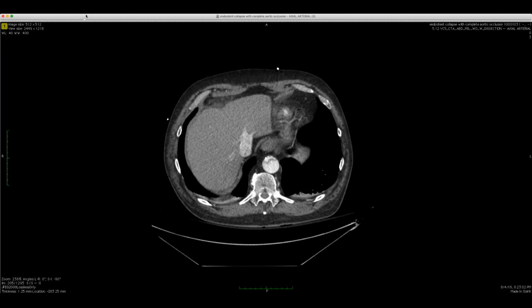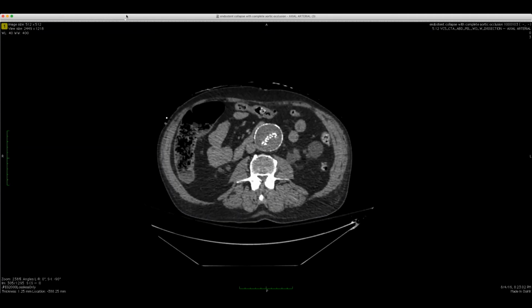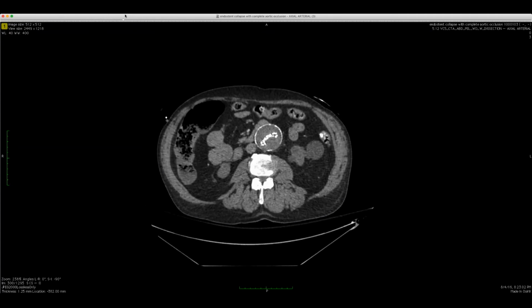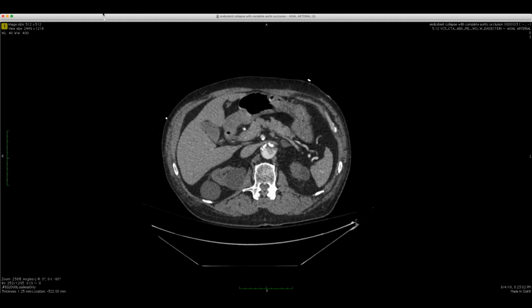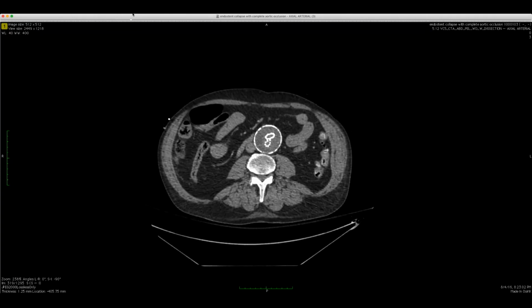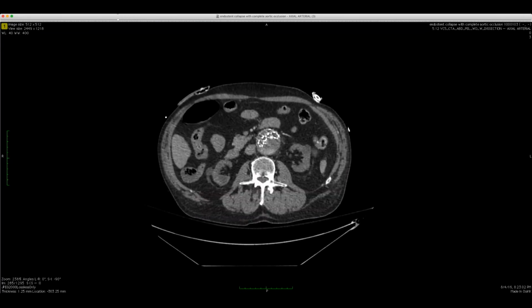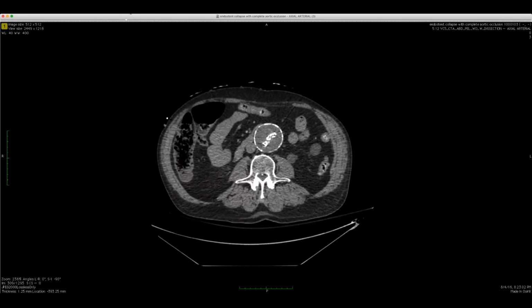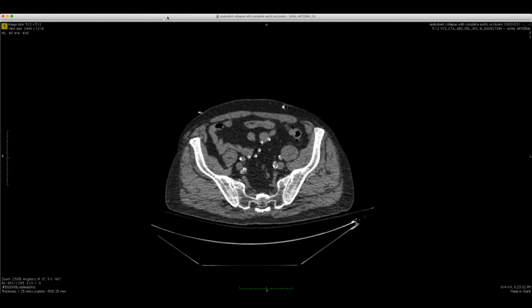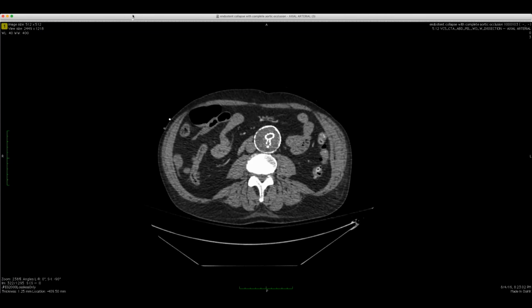I think the presence of the new dissection probably played a role, but I'm not quite sure how that affected the morphology of the stent, but it certainly collapsed. And this is one thing that you always hear about as a risk, but this is a dramatic example. So, Brent, is the pressure that high outside the stent that it just crushes it?